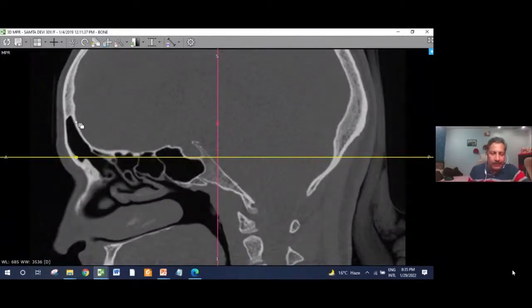The sagittal plane gives you maximum details of the frontal recess anatomy, which you require surgically, regarding the orientation of the cells which are attached to the various walls of the frontal sinus, the drainage pathway of the frontal sinus, and all that. The relationship of the sella and the sphenoid sinus is best ascertained on the sagittal plane.